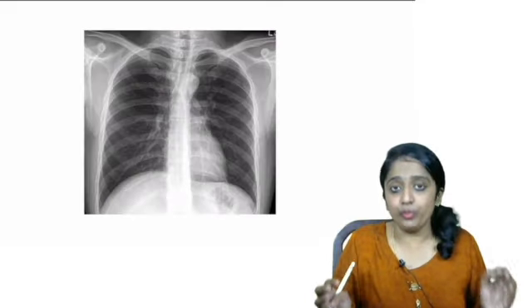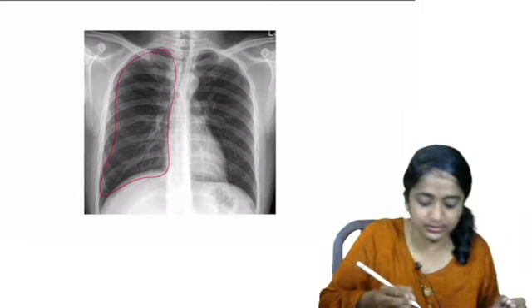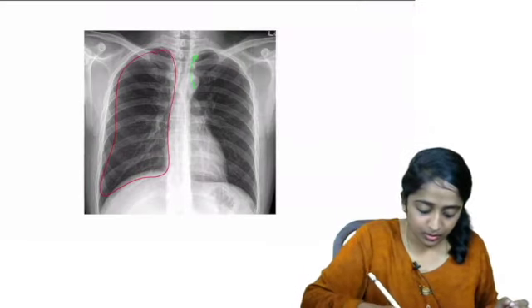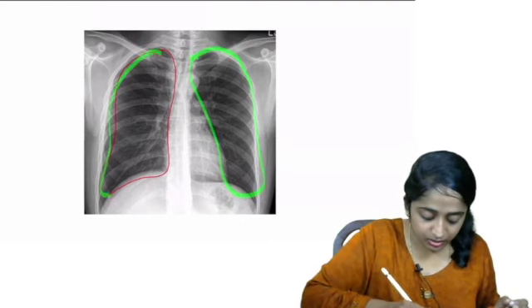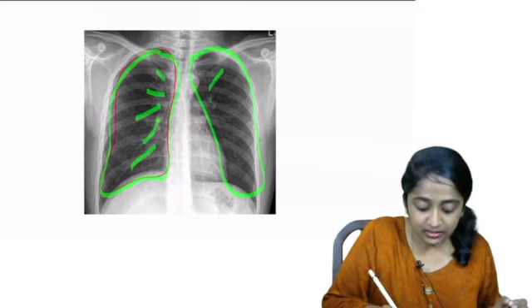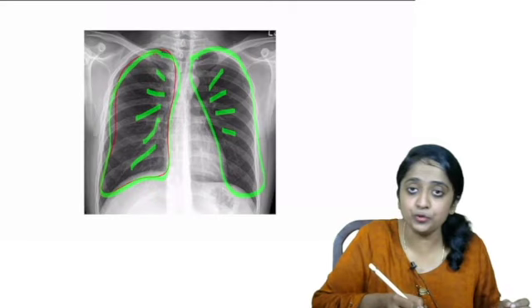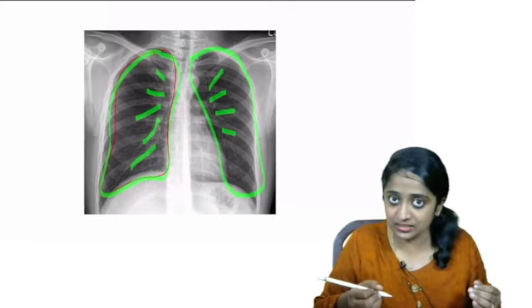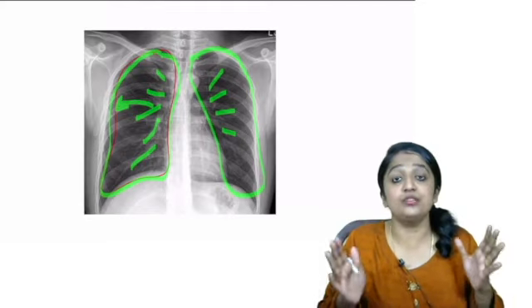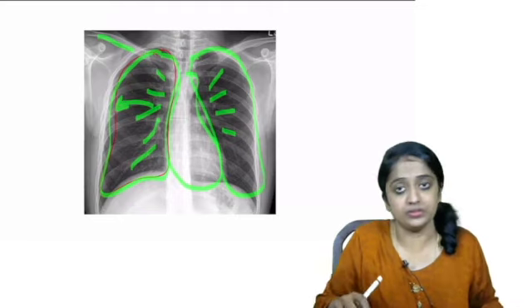So this is a normal radiograph of the chest where you have the clear, black lung fields, and in between these, linear radiodensities, which are the vasculature. Normally, as you go from top to bottom, they increase in intensity and number, and from center to periphery, they decrease. This is the normal pattern. This is the region of the heart and the vessels, and the rest are the bones.